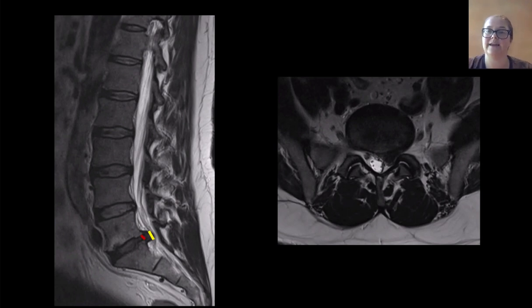And then you could say, not only is this nerve root pinched, but if you look at the thecal sac, you've got some compression and probably those nerve roots are a bit crowded. So you could say there's also mild narrowing of the central canal or effacement of the thecal sac with minimal crowding of nerve roots laterally. So I suspect clinically the biggest area of concern is going to be S1, but the lower sacral nerve roots could also be affected.